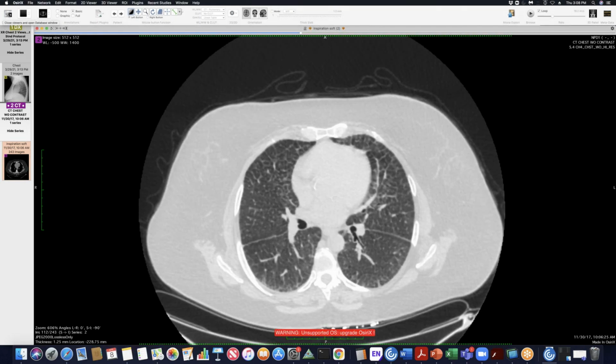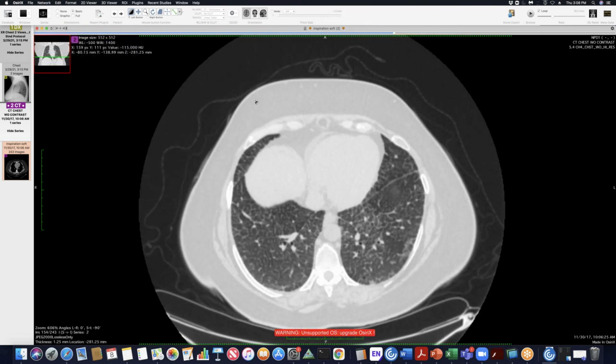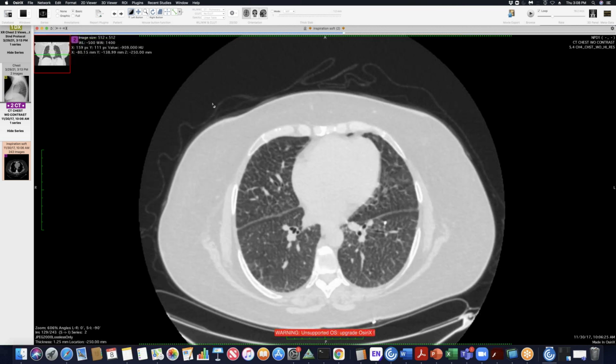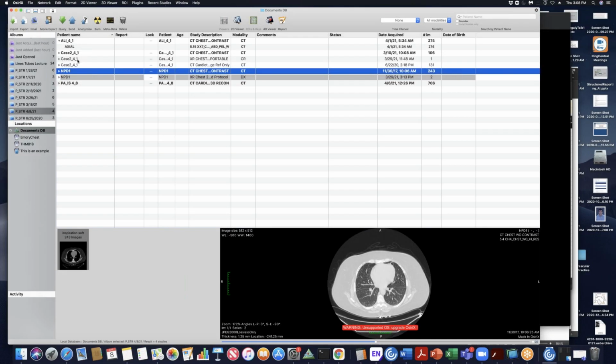Yeah, I've seen a couple cases of this as well. It looks exactly like it, and Gaucher's disease can look like this, and also congenital lymphangiectasia. That's a nice example you have. Unfortunately, the biopsy was done years ago and somewhere else, and I wanted to look at it, but didn't have access. Anytime you see chronic septal lines, I think storage diseases are always a good thought. Amyloid too.